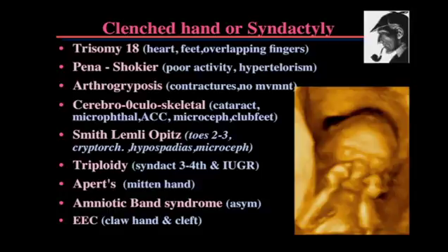triploid. And so the abnormalities are vast in fetuses with triploidy. There are very many abnormalities. But I guess the best way to spot a fetus with triploidy is the severe early onset intrauterine growth restriction that they have, IUGR. This is very easy to spot in the first trimester and quite dramatic.